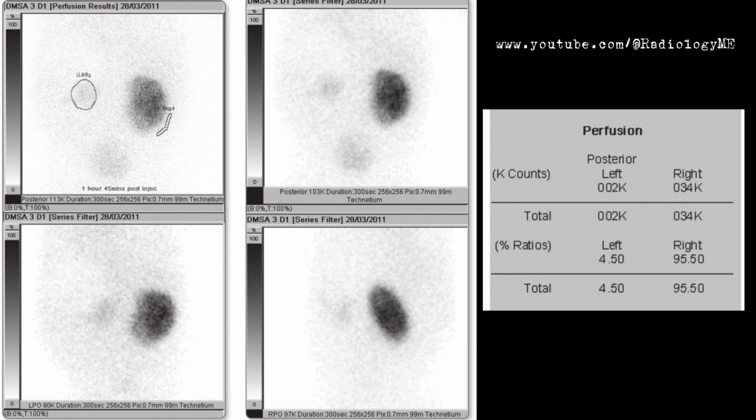changes or associated abnormalities. In summary, this is a case of a 14-day-old infant with multicystic dysplastic kidney on the left side. The right kidney appears normal, but further follow-up will be essential to ensure the function of the contralateral kidney remains intact. So, that's a wrap on this case.